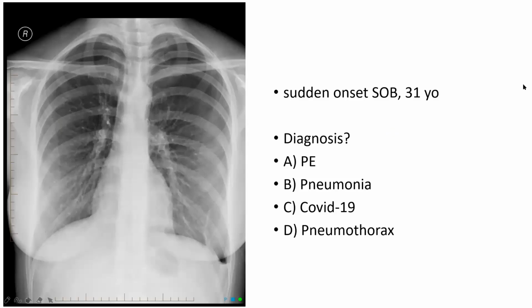Okay, final question. I hope you can see this one. Patient has come in with sudden shortness of breath, 31-year-old, pleuritic chest pain. What is going on here?